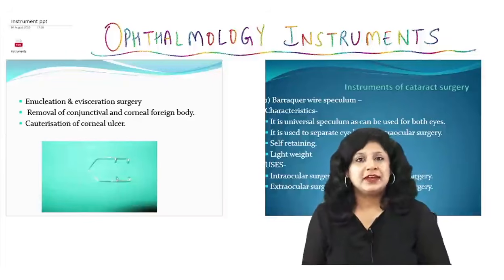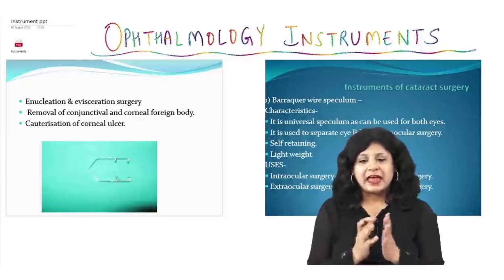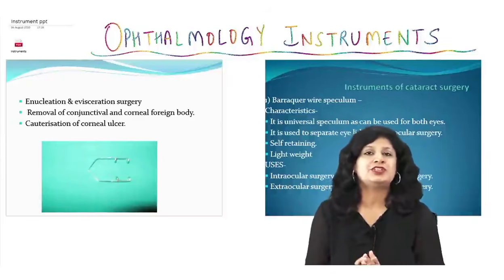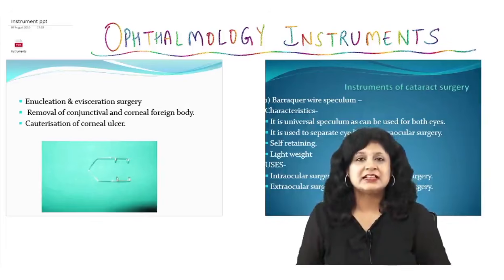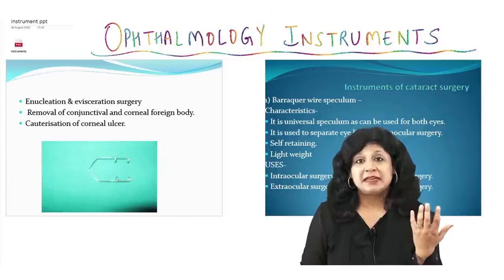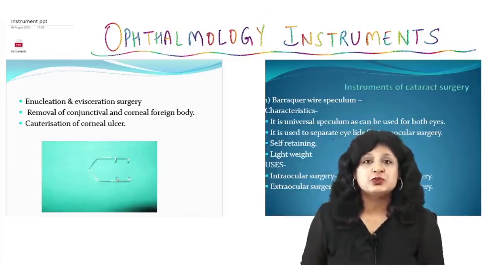So today we are going to deal with the ophthalmology instruments, and my purpose to deal with the ophthalmology instruments is dual. You know that so many times in the practicals and the viva these instruments are kept, and you are asked to identify the instruments and tell their uses.